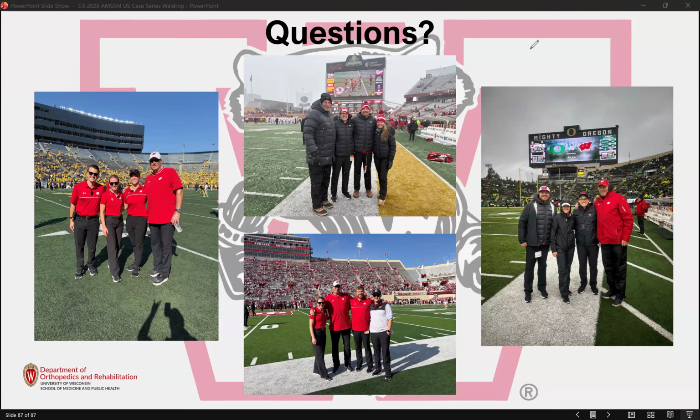Yeah, and I think we've talked a little bit about this in previous cases for the knee. One thing, as you included in your protocol, is to be looking at the suprapatellar recess. If you start to see fluid in that area, you would be concerned that even if they have this Morel-Lavallée lesion, they might have concurrent intra-articular pathology, which would lead you to still go ahead and get the MRI to evaluate further for any pathology.